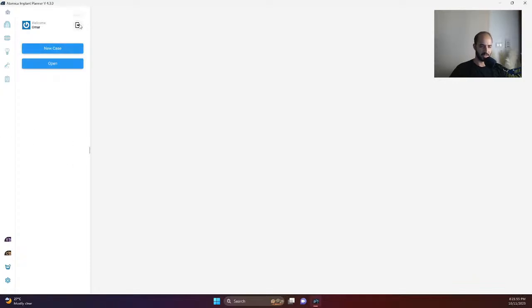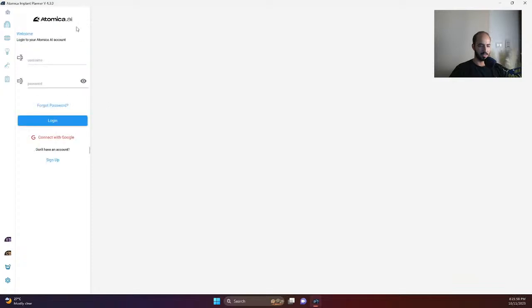Before taking a simple case, how about we log out again and let me tell you how to sign up into our software and have access to it. To have access, you need to sign up through our software from here, the sign up button on the bottom, or you can connect with your Gmail directly, connecting with Google, and you'll immediately have access to our software. So let me go ahead and sign in pretty quickly. Again, right here.